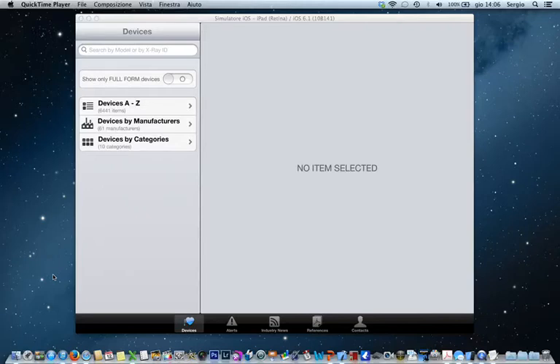This is the video tutorial of iPacemaker 3.1 for iPad. iPacemaker is a unique application designed for health professionals operating with cardiac implantable devices. It provides the most complete database with more than 6,000 cardiac devices, pacemaker, defibrillator, leads, cardiac monitors, including technical sheets, product alerts, manuals, battery projections, survival curves, guidelines, and other things.